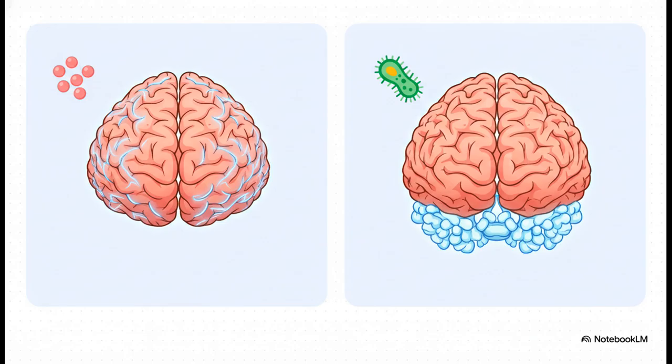Just like with calcifications, not all meningeal enhancement is the same. In your standard bacterial meningitis, what you see is leptomeningeal enhancement. The contrast just fills up the sulci, basically outlining the surface of the brain. But TB meningitis plays by different rules. It has this classic love for the basal cisterns.